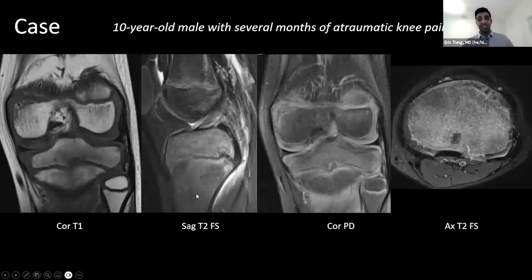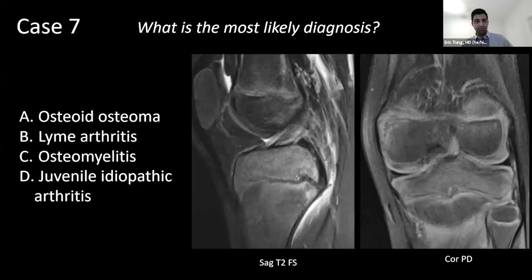This is a 10-year-old male with several months of atraumatic knee pain. What's the most likely diagnosis in this patient?